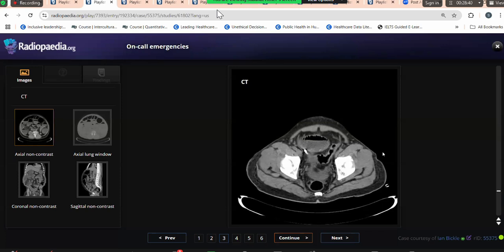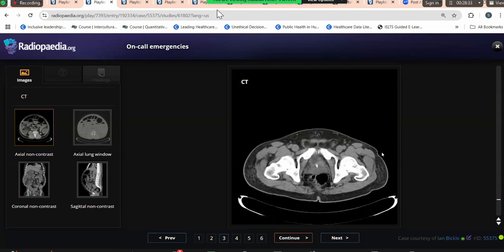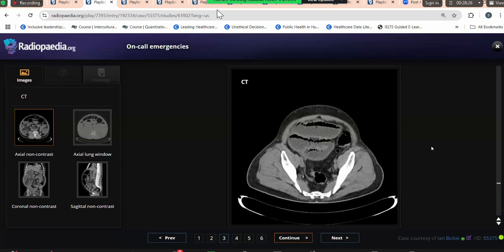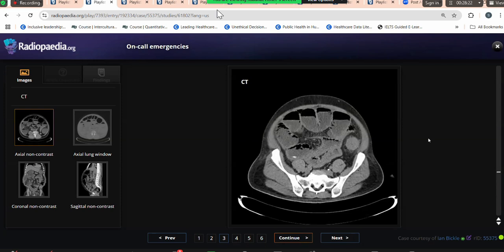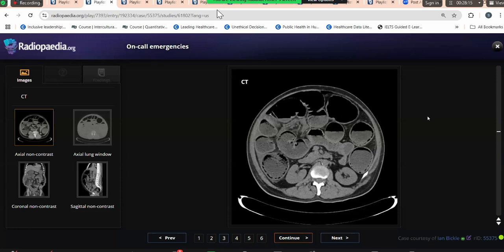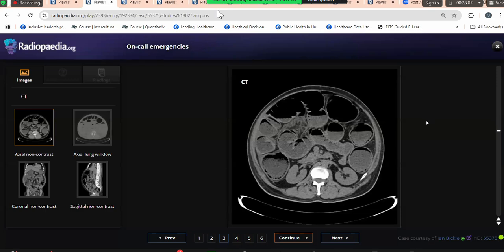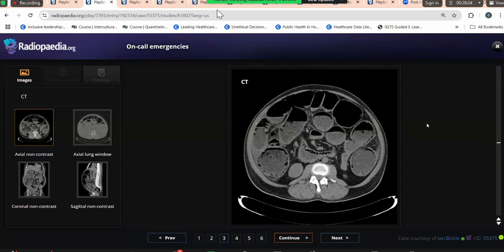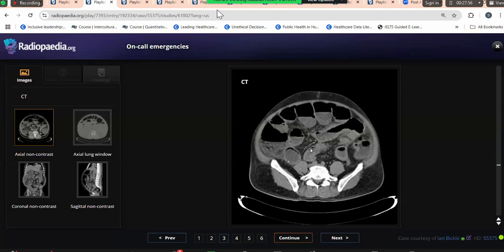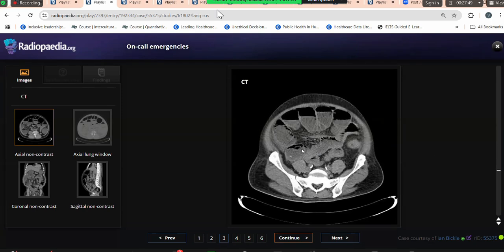So based on the CT images, what is the etiology of this bowel morphology which you saw on the X-ray and on the CT? Can you pin it down? Ma'am, in my normal practice, I would confirm it on the coronal window, but it appears to be. No, in the exam you will not get the coronal windows. Can you trace the bowel? You saw the dilated descending colon, isn't it? Yes, ma'am. So keep your arrow on the descending colon, trace it, and you'll find the etiology. Tell me the etiology here. There's some lag, it's not moving. Don't worry about the lag. Take your time.